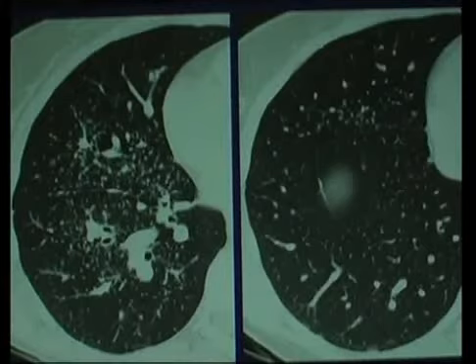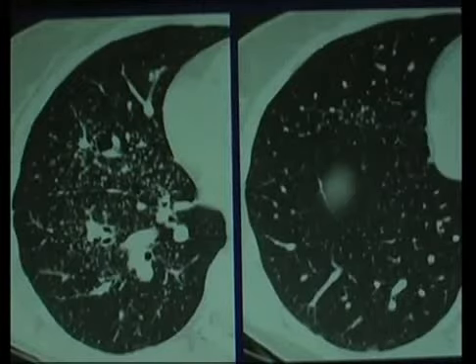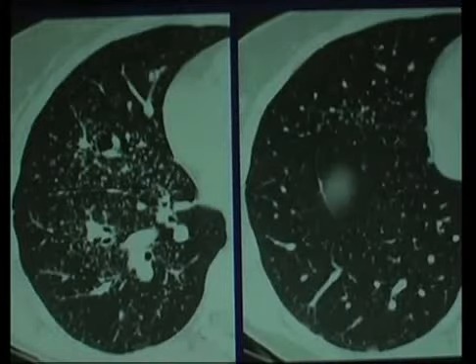Sarcoid tends to be more upper lobe than lower lobe, which is another key to the diagnosis. So typically you're going to see much more of a profusion of these things in the mid and upper lung fields, much less of it in the bases. Now, obvious point, and this pretty much pertains to all lung diseases, and it's not made clear enough in most lectures. Most of these diseases don't actually have a static appearance. Sarcoid's a great example of this. Hypersensitivity pneumonitis is a great example of this.